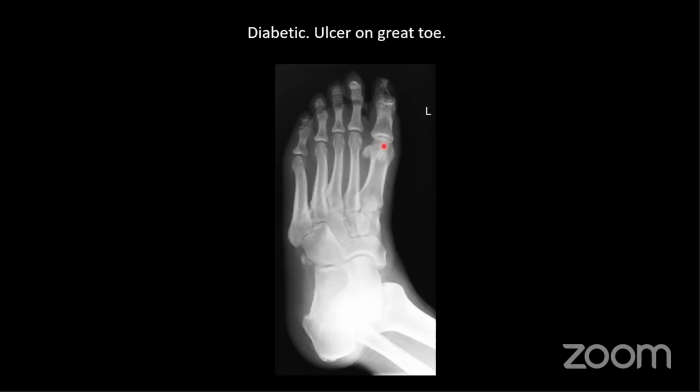Even if there is osteomyelitis, the bony changes on plain film don't necessarily manifest until slightly later on. We often say repeat the film after a week or 10 days, and sometimes you'll see early changes. You might not see really florid bone destruction like this, but you might see a bit of periosteal reaction or some early features.